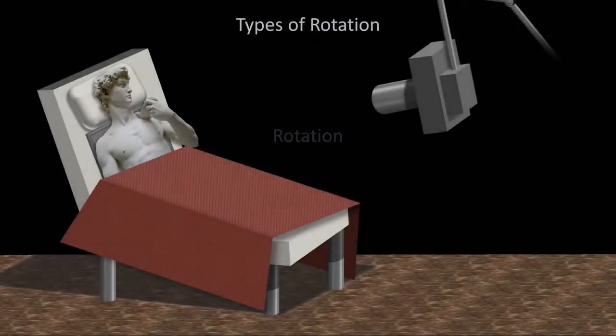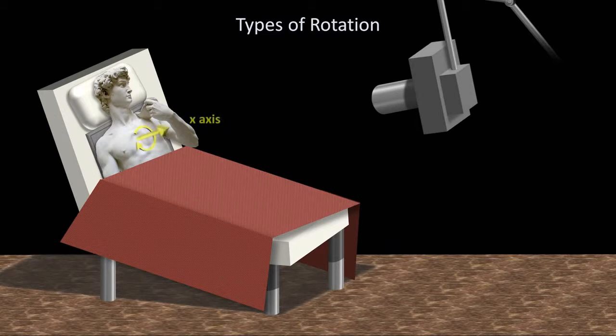What are the ways in which the patient can be rotated relative to the X-ray beam or film plate? Like all three-dimensional objects, patients can be rotated in three different ways, each around one axis. The patient can be rotated side to side, as if he or she is leaning to a side. The patient can be pitched forward or backwards, or he or she can be turned such that one side is displaced forward while the other side is displaced backwards. Each one of these rotational displacements leaves evidence on the X-ray and also impacts the reliability of the X-ray interpretation.